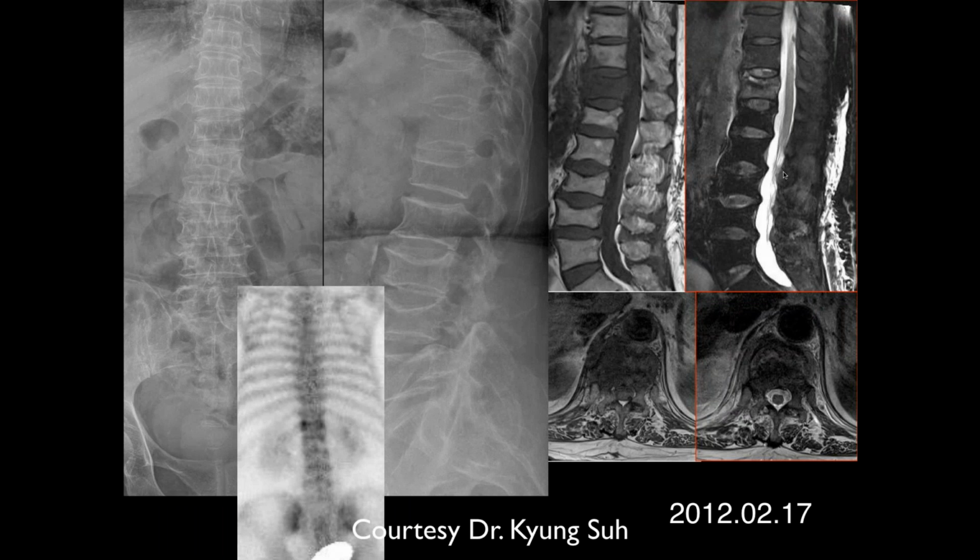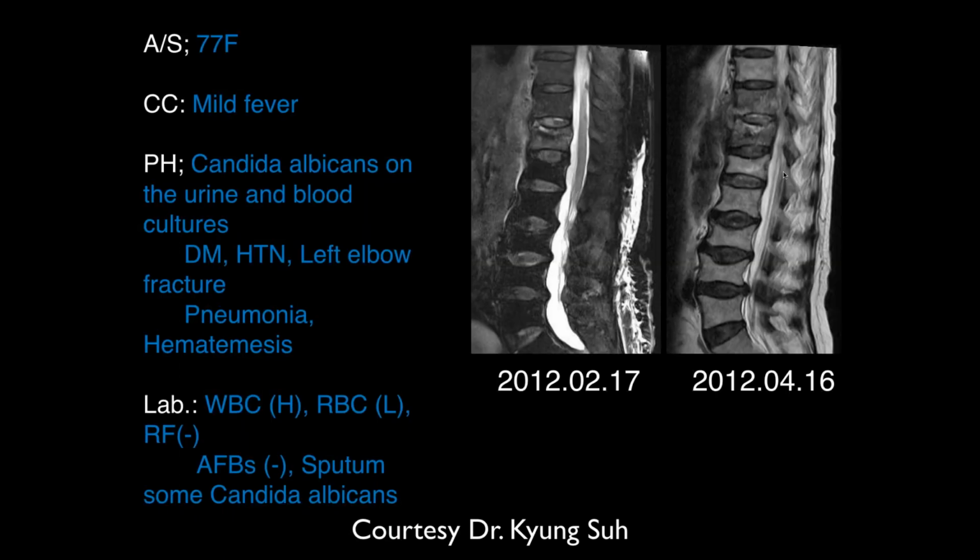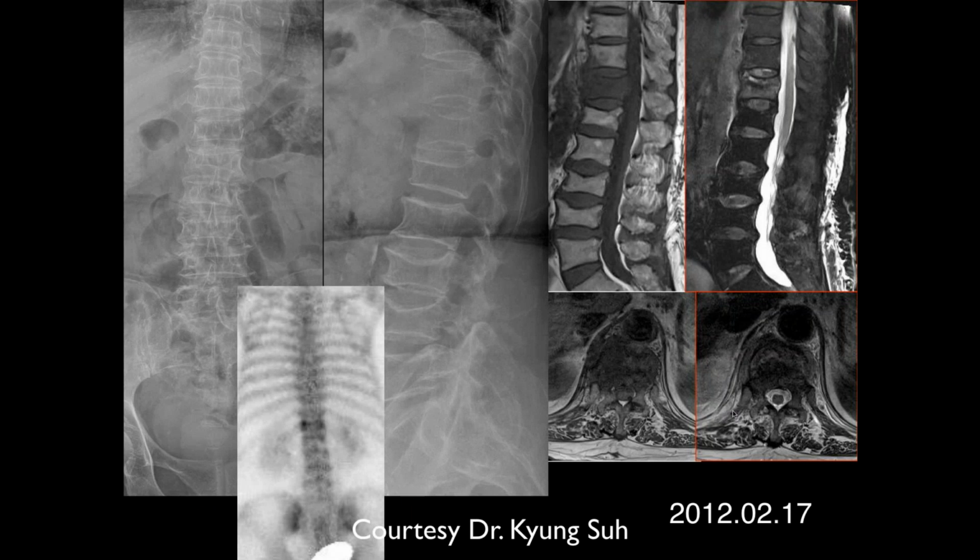Okay, so let's go back here. This is 2/17/2012, 4/16/2012, and then here we have 2/17/2012. Okay, so now it's almost complete. Which one is the earlier one?